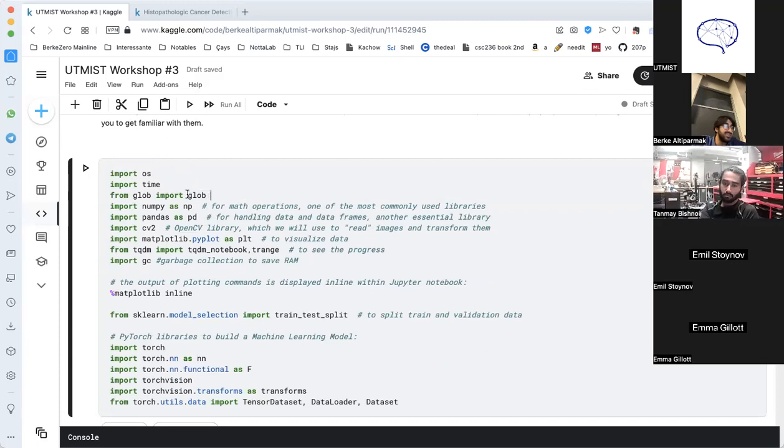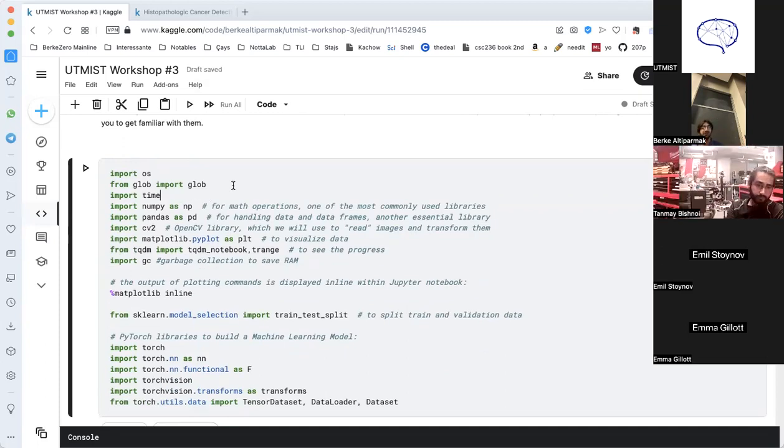The first 2 libraries, excluding time, we use in most of our Jupyter Notebook projects, to enable us to display better. And then this is our time library.